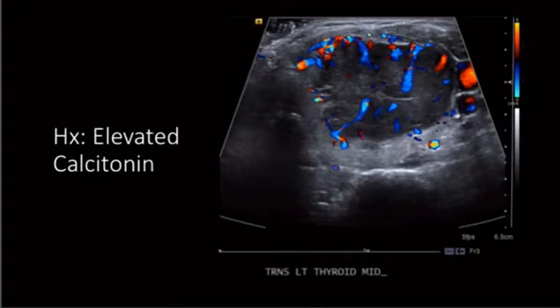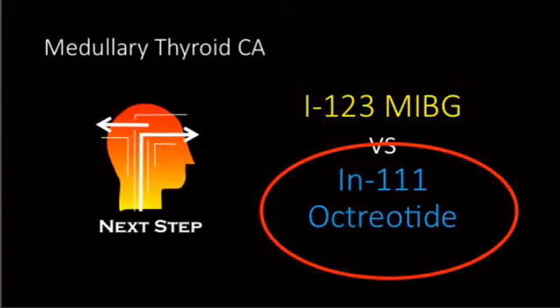All right, so here's a thyroid scan, and I've given you a significant hint here by telling you there's an elevated calcitonin. Remember, the most common thyroid malignancy is the papillary subtype. Given no hinting information, remember the papillary is popular, they would also probably show you microcalcs. But when they start telling you stuff like elevated calcitonin, or they could hint at an MEN syndrome, then you're going to think, well, that's a medullary subtype. Medullary subtype is special, has an MEN2 relationship.